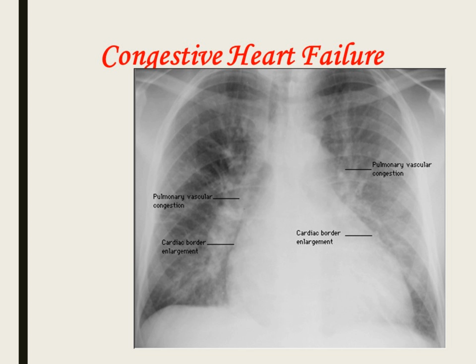Distinguishing CHF, sometimes pulmonary edema, from other things like ARDS or acute lung injury, can be tricky, someone on the ventilator. But you follow along and look at other things like the heart size, trying to make the best call. Question on edema? Congestive heart failure, yay!